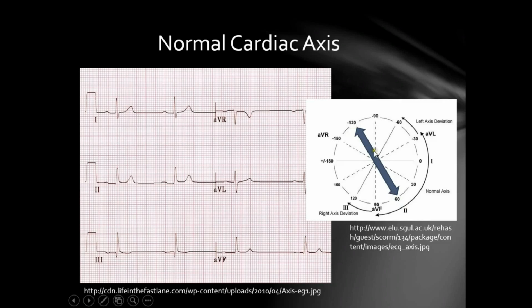And to know to which direction it is pointing, we have to look at some of the other leads. So for example, you can see here that leads 1, 2, 3, and AVF are all positive.